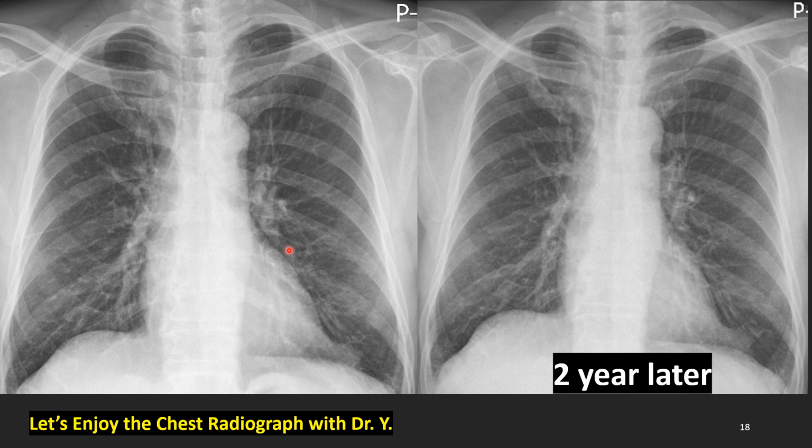You got something? Have you found out the difference? It's not possible, not only for you, but also for me. Here, look at this. This is normal. How about this? Something slightly denser than before? Yes. Not so remarkable, not so identifiable.